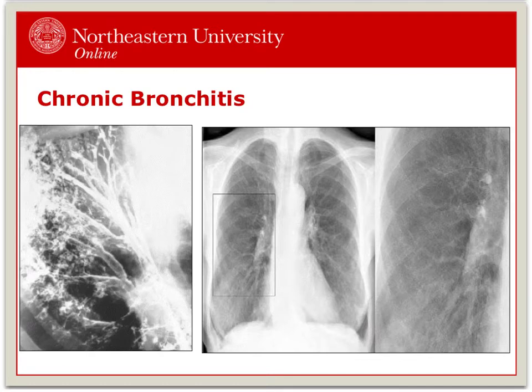In both images 2 and 3, we can see mucus plugs as radiodense clusters in the bronchioles. For physical therapists, looking at this would indicate the need for airway clearance.